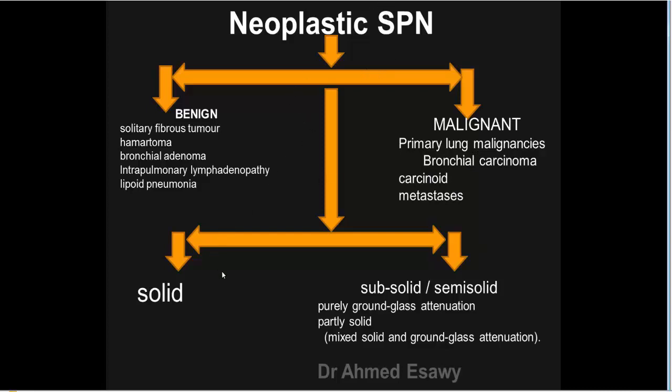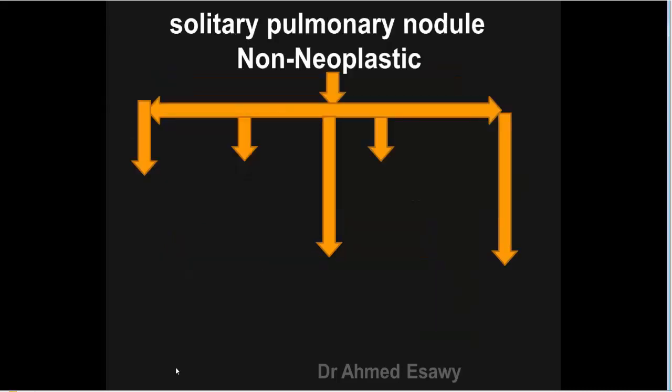Neoplastic solitary pulmonary nodule may be solid or subsolid, or semi-solid, not cystic. Subsolid or semi-solid means purely ground glass attenuation, or partly solid, mixed solid and ground glass attenuation.